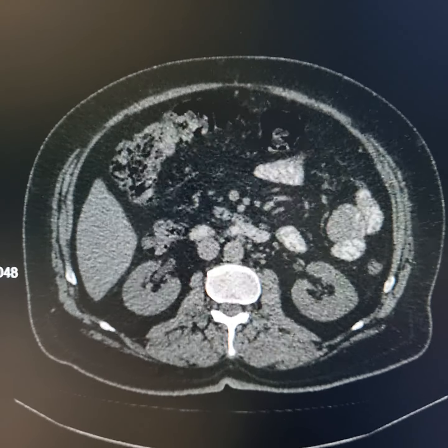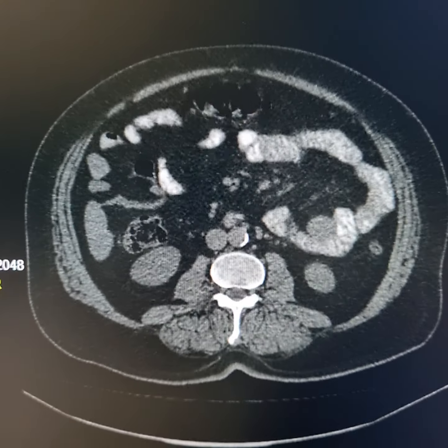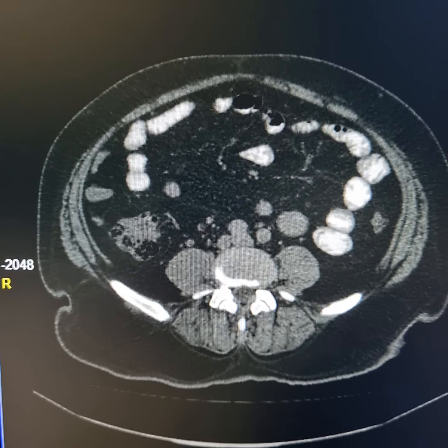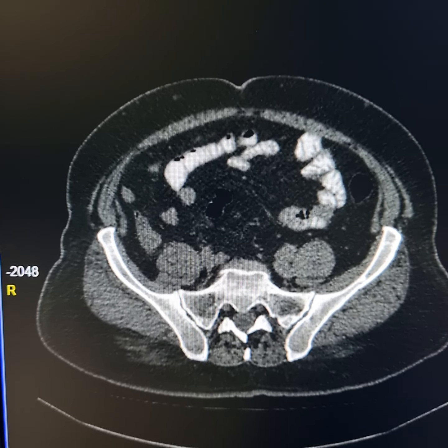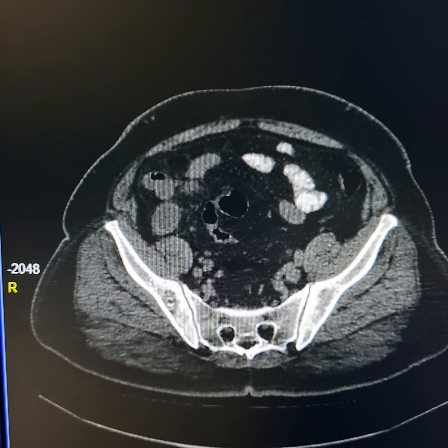Plain CT scan abdomen of a 65-year-old male patient. The patient presented with pain in the right lower abdomen. There was local tenderness. On ultrasound examination, there was a cystic lesion in the right iliac fossa. The patient was slightly tender to deep transducer pressure in this region.